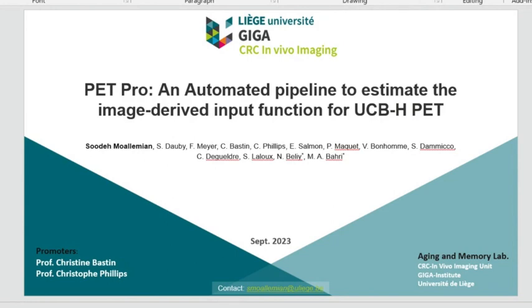So what does carotid detection do? It essentially divides the image into two time windows, injection and signal. From these two time windows, as you can see here, we will make the mean signal and injection maps.